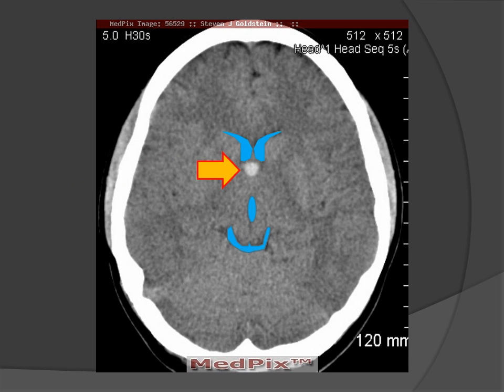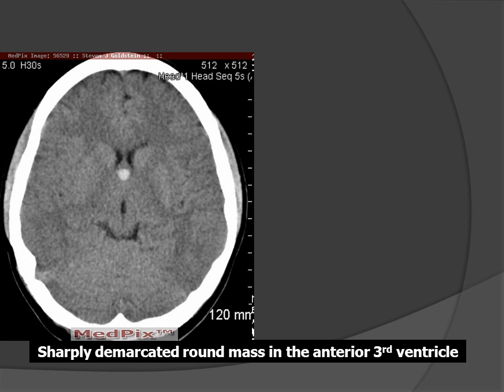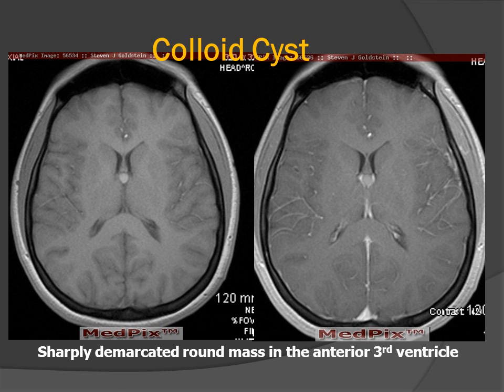However, there is an obvious mass lesion, a rounded, homogeneously hyperdense mass located near the anterior third ventricle in the approximate location of the foramen of Monro. If we look at the CT scan and then compare the follow-up MR scan, we can see a corresponding hyperintense lesion in exactly the same location at the anterior third ventricle, at the junction of the frontal horns of the lateral ventricle and the third ventricle. This lesion is most likely going to be a colloid cyst.